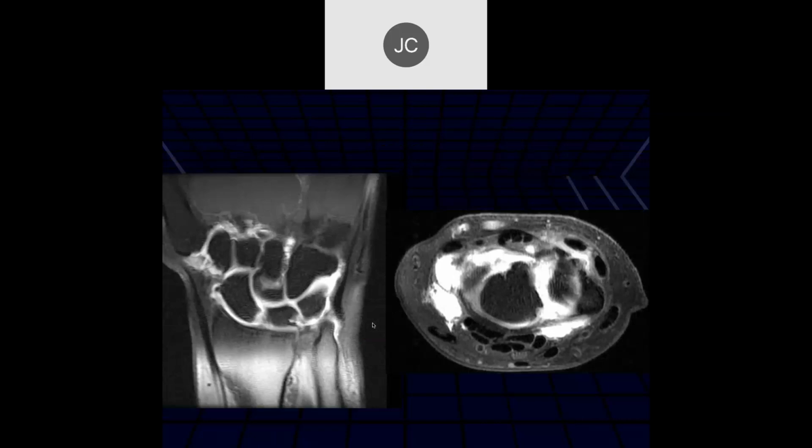Okay, Annie? Looks like again we see a defect in the scapholunate ligament. Yeah, this is an arthrogram. And then we also see that the volar, it's a little bit irregular and a little bit frayed. But dorsally, we can see there's a tear of that dorsal ligament with separation between the two. And that was an unstable tear.